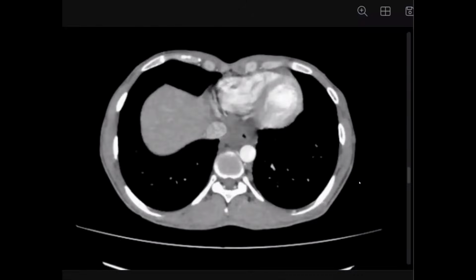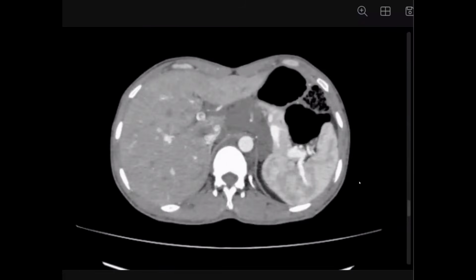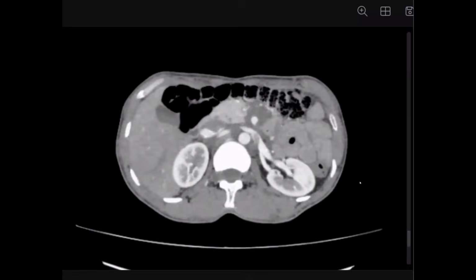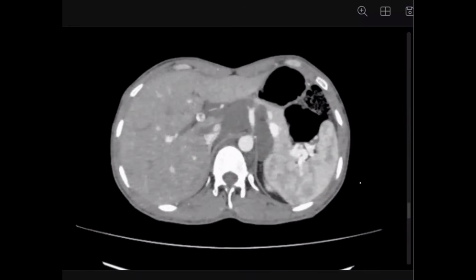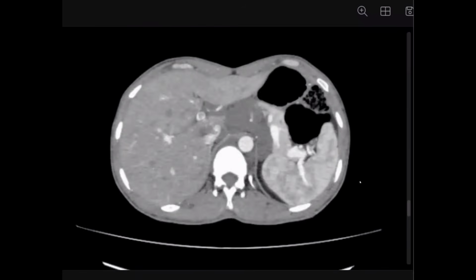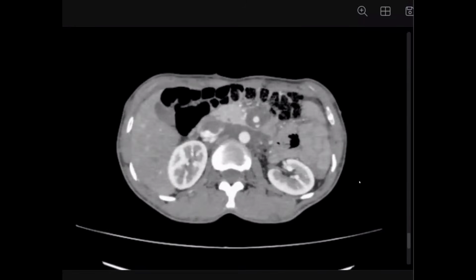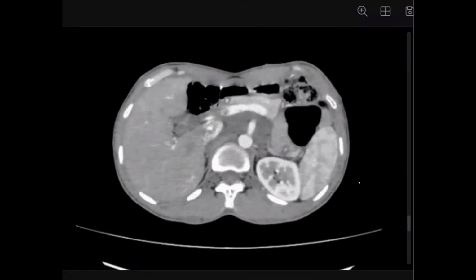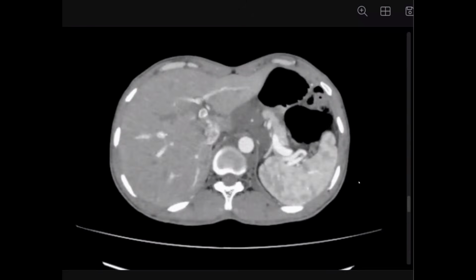Let's start first by the abdomen. Can you give me a description for this abdominal mass? Yes, there is a soft tissue mass in the para-aortic region, which is encasing the aortic vessels and anteriorly displacing the pancreas. This mass is also encasing the left renal vessels.